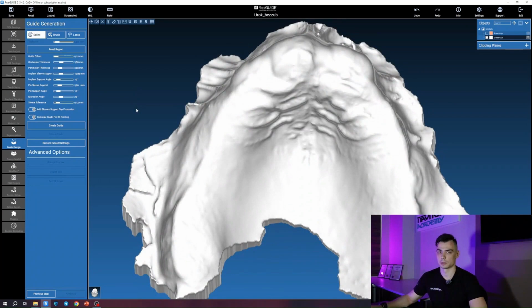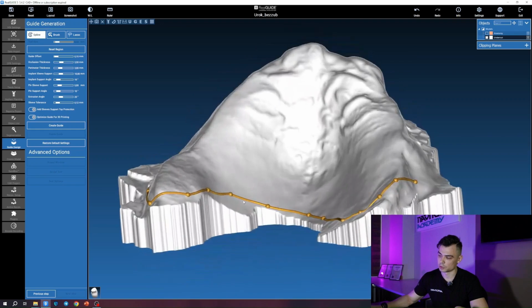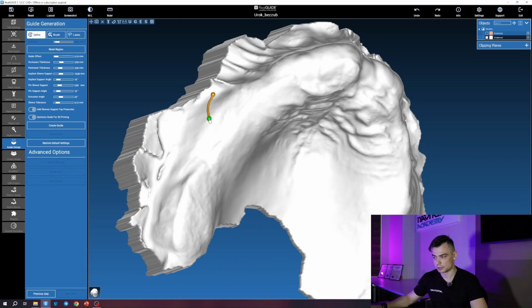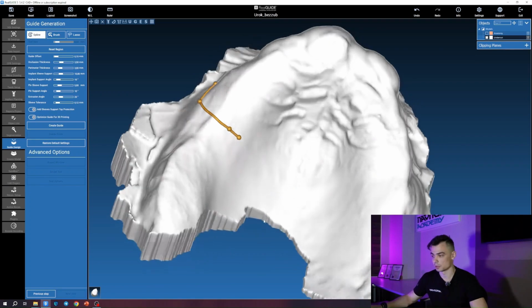I want to say right away, or rather, I'll repeat myself, this is not a plate denture. There's absolutely no point in making the border like this right now. In fact, it can actually make things worse. Why? Because again, the mucosa can change its configuration, so you need to work only in the area of the attached mucosa. And accordingly, remember that this template you're making will be the prototype for your surgical guide. So you can, without going into details, just follow along with what I'm doing right now.